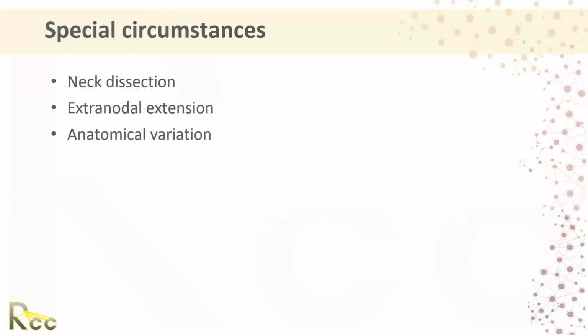You know, that's an excellent question. That, again, depends on the patient's habitus. Sometimes we have very thin patients, and if you feel that it is quite superficial, you may use a bolus. I frequently will consider using bolus in the surgically dissected neck, and that's where I'm going to touch on it. For neck dissection, there is a change in the lateral border. And when we have a neck dissection, you are going to come more superficially, and you may be including either the medial half of the sternocleidomastoid muscle or the entire sternocleidomastoid muscle. And then that definitely would consider bolus, but that's a great question.